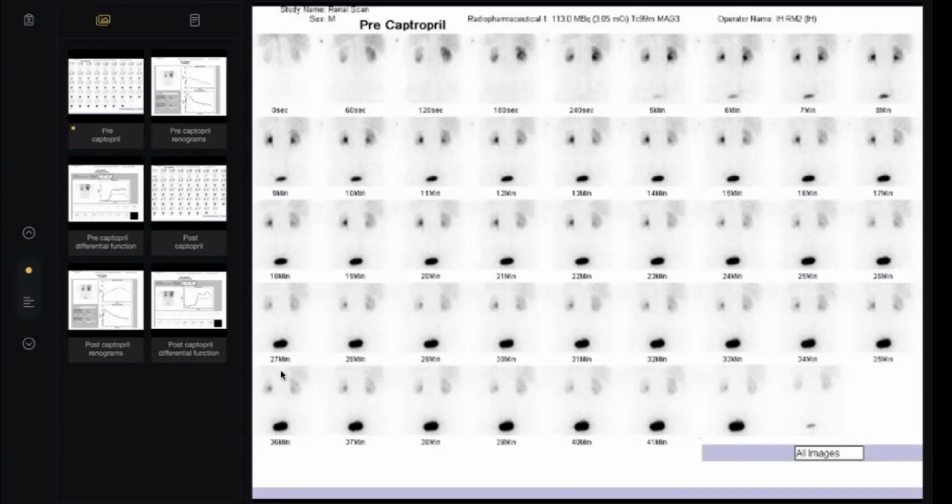What do you think about this one? Oh, no, this one. For example, here. What happened here? Could you tell me? At this stage, after 25 minutes, there is total excretion of the left kidney, but there is still a secretory process in the right kidney. Could we go backward? Here. The excretion of the right kidney, nearly complete excretion, at least here, 19 minutes.